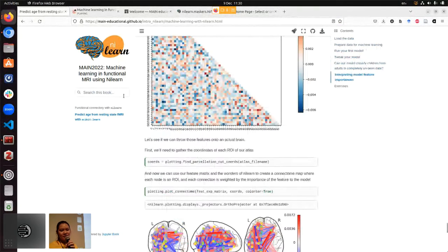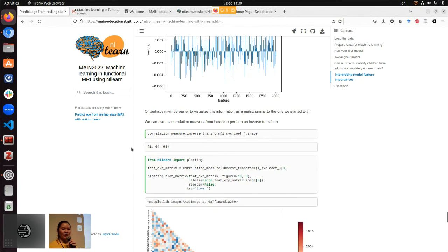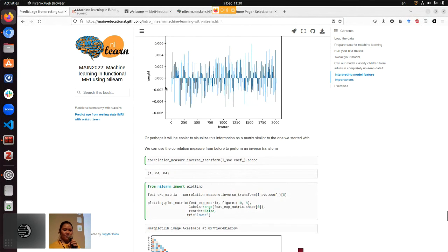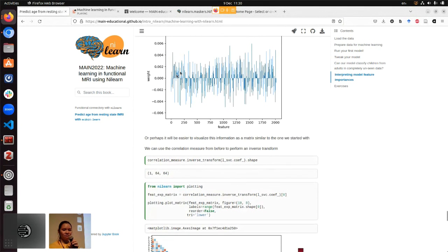So the question for people who are tuning in online is, what does this plot mean? This is just plotting everything you see over here in one sequential order. These are the weights that the model decided on. It's like this edge is more important, so I can focus on this edge. It's decided this person is the outer.